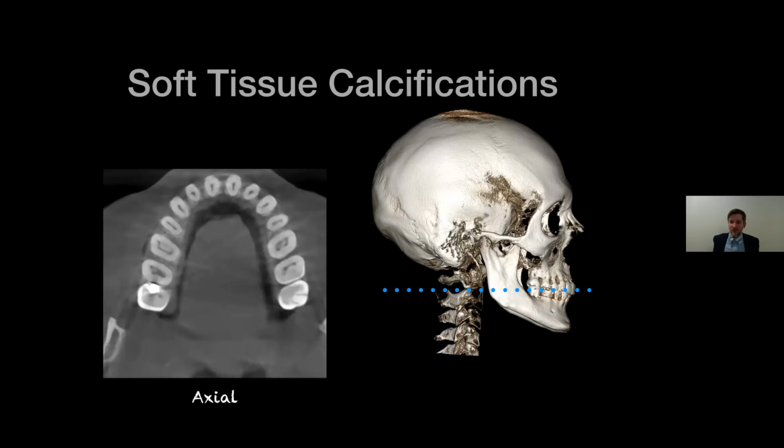I am not an oral surgeon, but I can tell you that if the apices or any part of that tooth are touching the canal, the cortical plates of the mandibular canal, there have been studies that have shown around a 20% chance of either temporary or permanent paresthesia, anesthesia, some sort of numbness in the area.